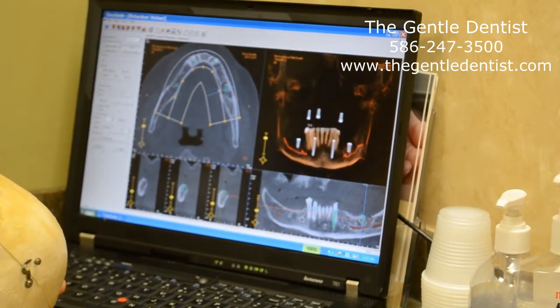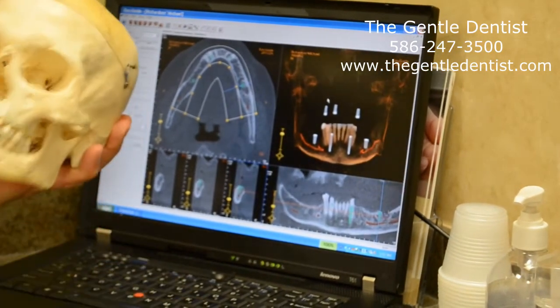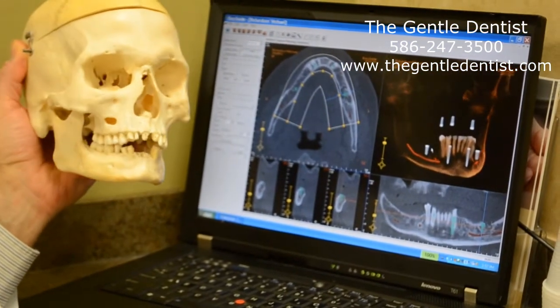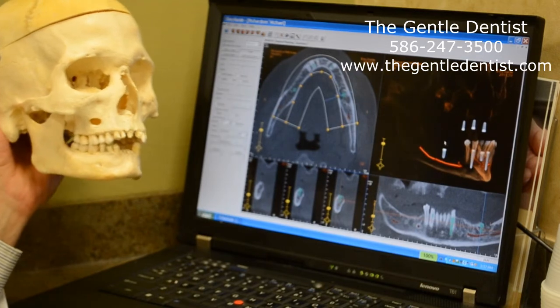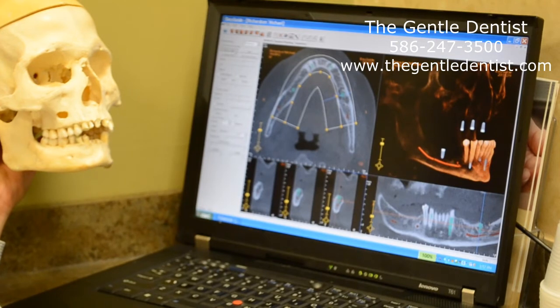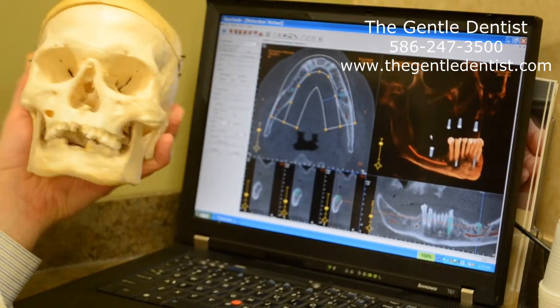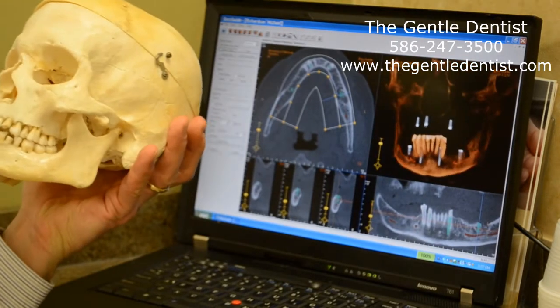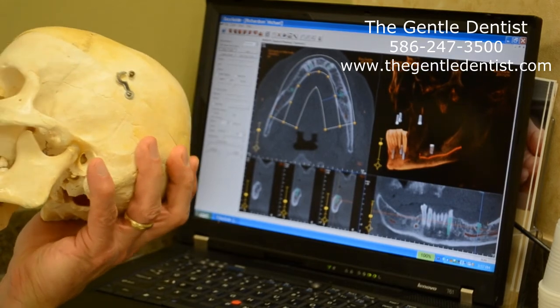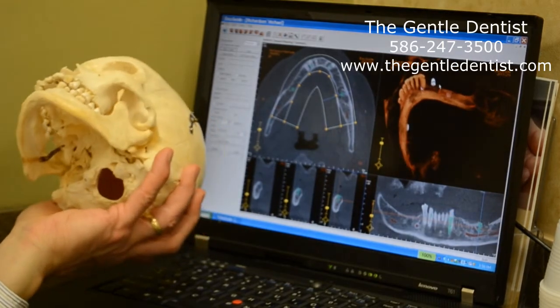Okay, so this shows, for example, a skull, something like this. But now what's really neat is we can take that skull and we can actually turn it like this, and we can make it look on the side like that. There we go. And then we're able to twist it around like that and manipulate it to make it look like I'm holding its skull, except it's all done through the computer. Or we can make it tip up like that and look like underneath the chin area here.